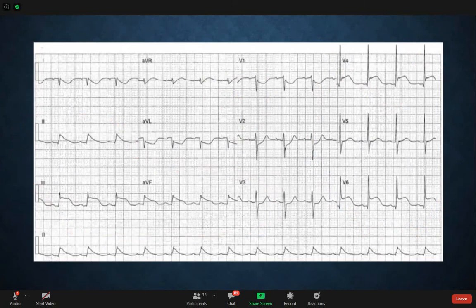The length of the R wave or the S wave is important sometimes, for example in left ventricular hypertrophy and these things, but I don't want to complicate things. Let's be systematic and simple, and then you guys add on. You can read later about wide QRS and how to read it, or about left ventricular hypertrophy and how to calculate it. Right? But take it step by step. For now let's be simple, systematic and we'll go from there.